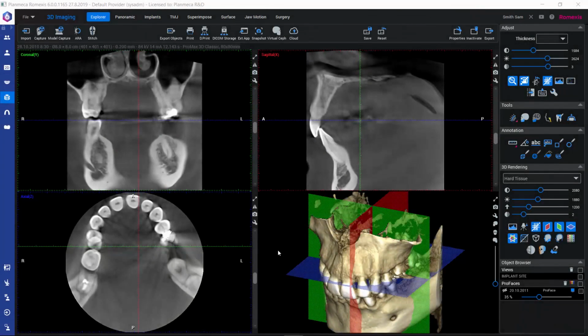In this tutorial, let's have a look at how we can navigate inside the 3D volumes so that we can examine them and make findings. As we know, these slice views here display the actual data, and this here is a 3D rendered view of our volume. If we activate these colorful planes here under the 3D rendering tools, we might better understand from where these slice views are currently taken.